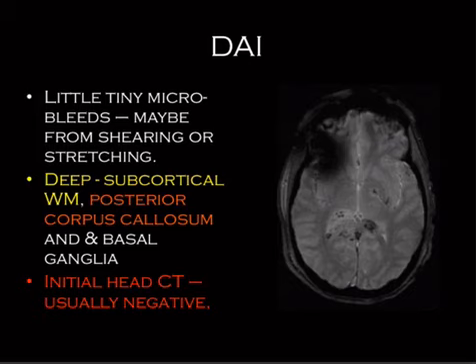So you can have a patient who's in a bad motor vehicle accident or high-speed trauma, get a head CT, and it's normal. The clinical history is that they're obtunded or in a, quote, coma, and it's like, oh, that's weird, because the CT looks really negative. Yeah, that's because he has bad DAI. And then you get the follow-up MR, and this is what you see.